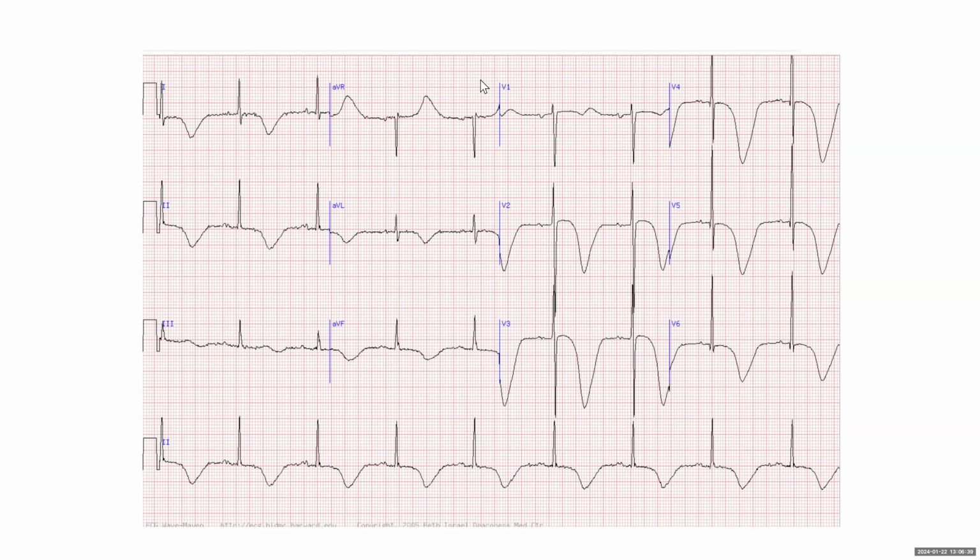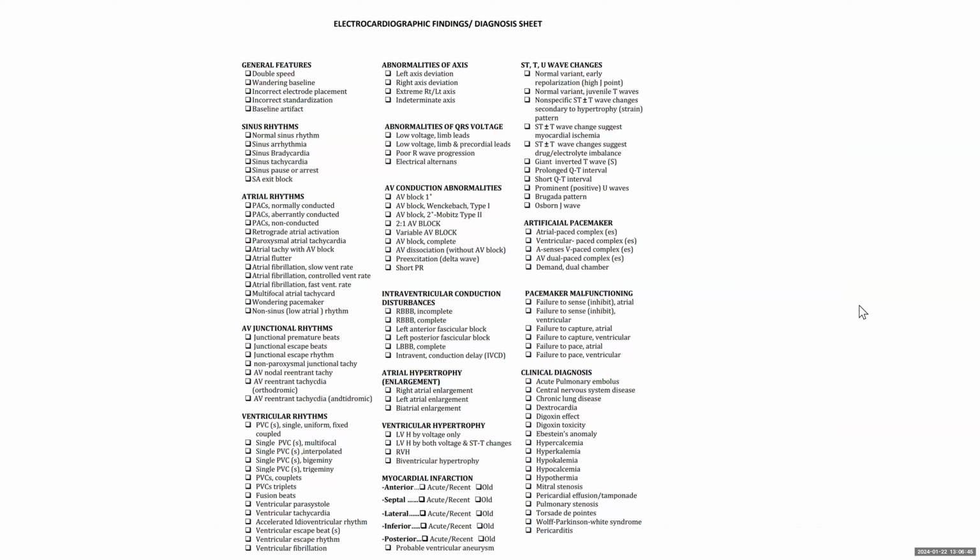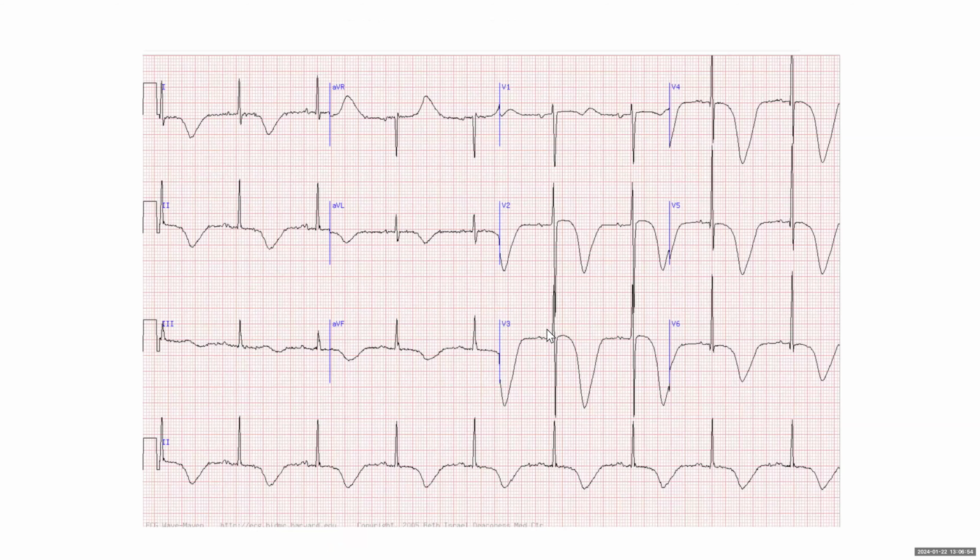This is called giant T-wave inversion. So if you see, there's something here called giant inverted T-wave. Now there are other things, of course, but this is giant T-wave inversion.